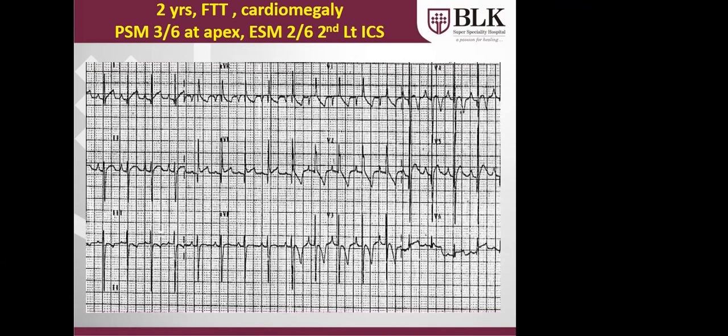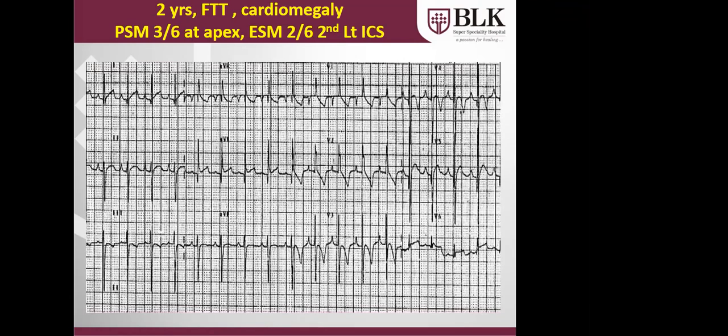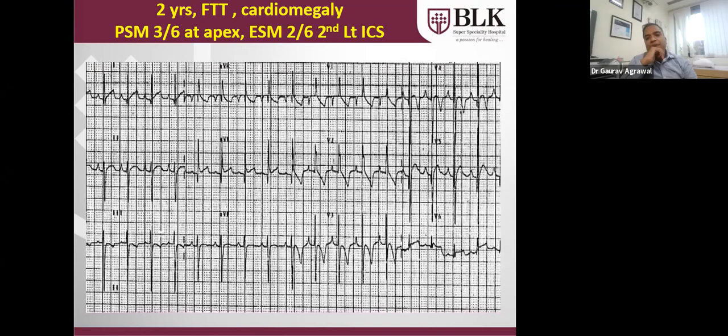Right axis deviation. Lead 1 is positive, lead AVF is negative. So left axis deviation. Yes, this patient is having left axis deviation. This is typically seen in ostium primum type of defect or AV canal type of defect. Understood?